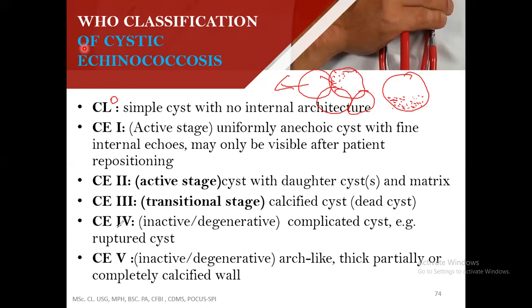Then echinococcosis stage 4, the inactive or degenerative stage. That is when the cyst is now inactive, meaning it will be forced to degenerate. It will start shrinking.